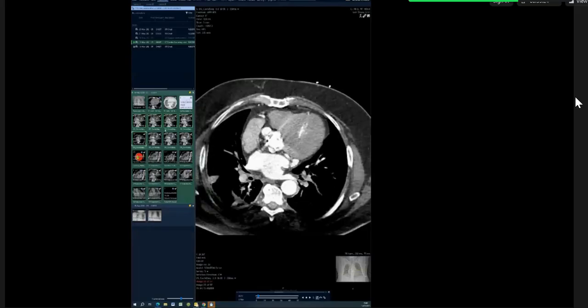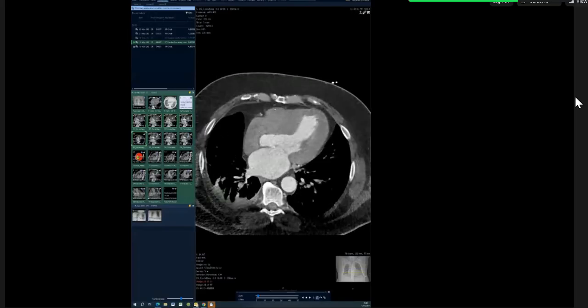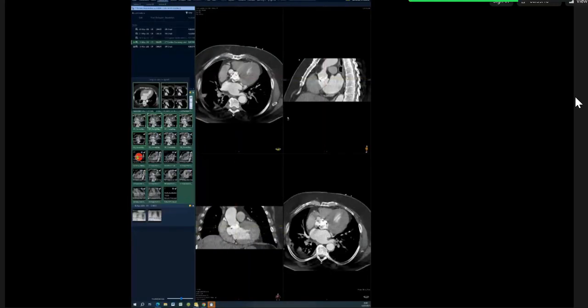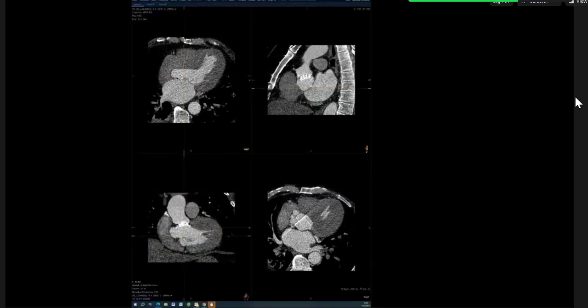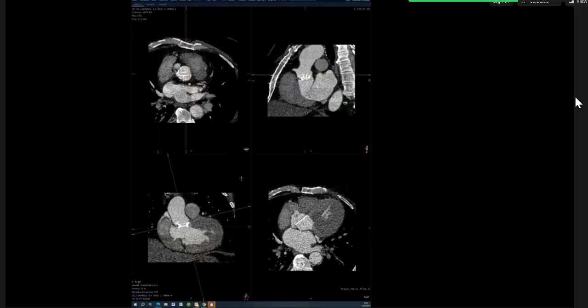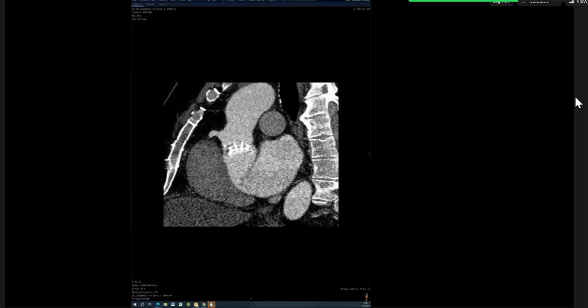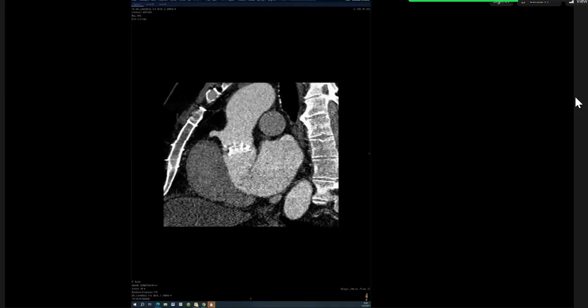So focus on the heart. There is left ventricular hypertrophy. The patient would have that anyway if they had aortic valve disease that was subsequently treated. I'll give you a cardiac MPR view. So look at the aorta. Look at this view. That's one coronary. That's the other coronary. That's the artificial aortic valve.